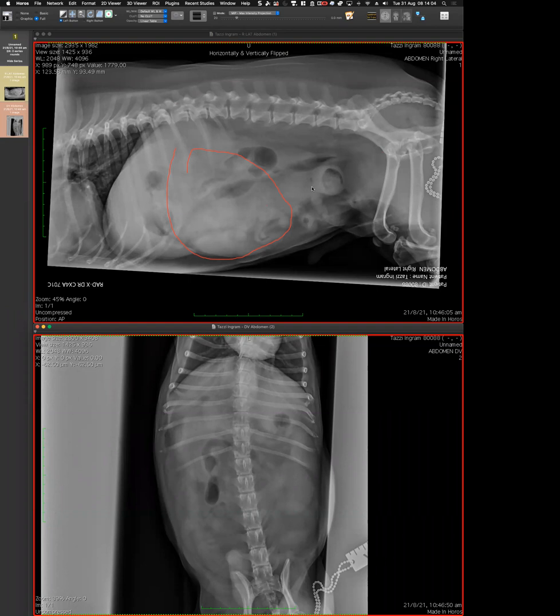But I think something that we haven't mentioned is this here, or maybe this, I'm not sure where the borders are. I don't know if this is the bladder or if this is the top of the thigh. I think it's the bladder, in which case, I don't know what this is. It's got some soft tissue and gas opacities. It's round.